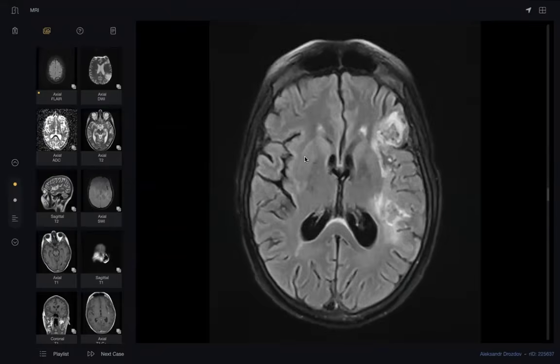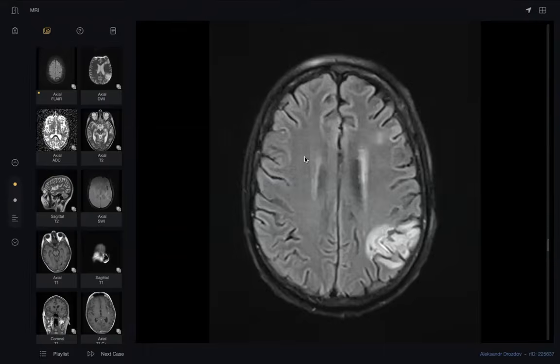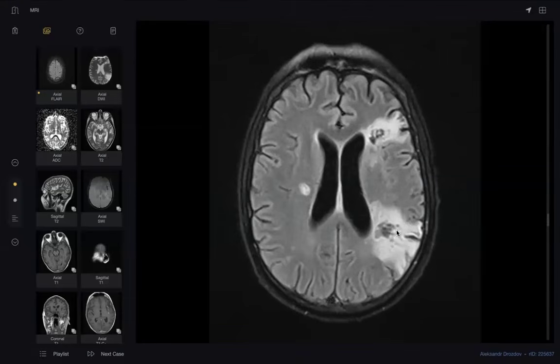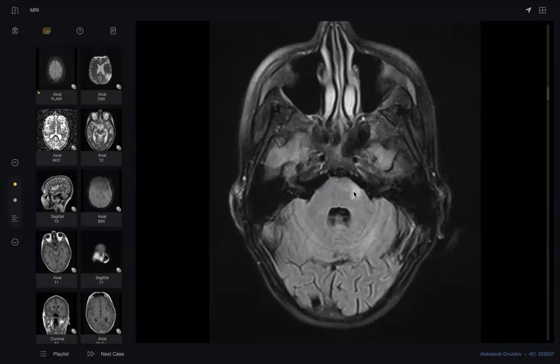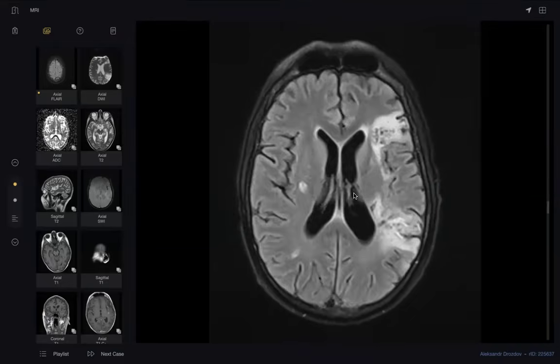Second, do you think this patient will be left for this long time for this embolic showering? See, one infarction here, and another one here. So keep vasculitis in mind, my colleague.